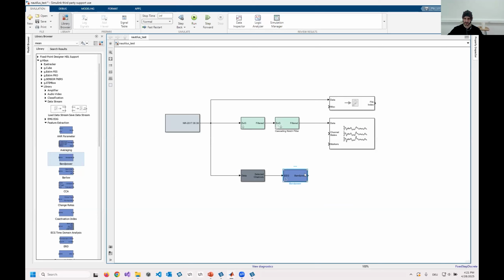And I'm also going to add a second node, which is identical for beta activity. So I rename this one to alpha, and I rename the second node to beta. So again, in Simulink, I can simply connect the nodes with this drag and drop editor. So we're getting data from the acquisition node, from the amplifier node on the left-hand side. Then we're selecting the 8 channels of the device. And then we're forwarding the EEG and calculating band power in here.